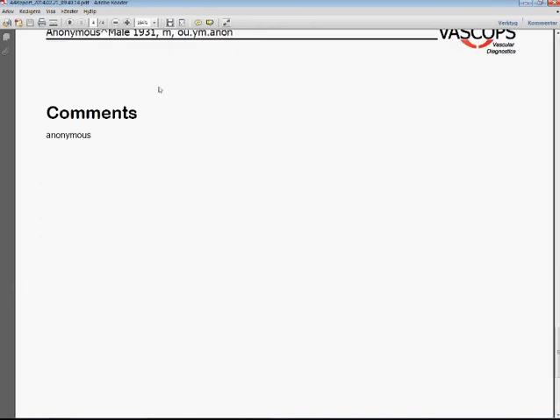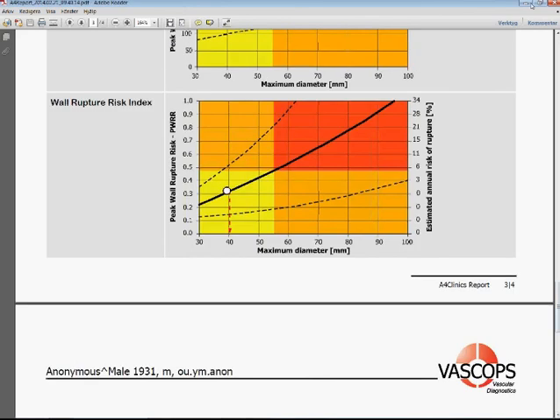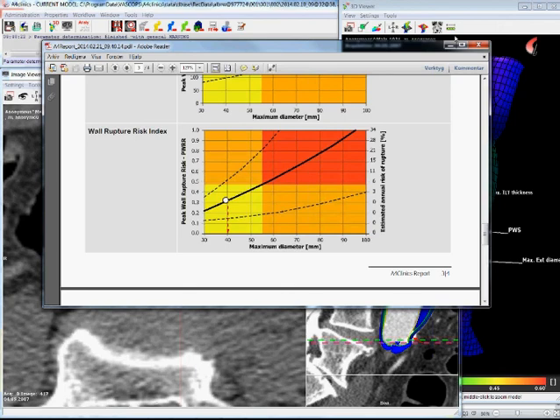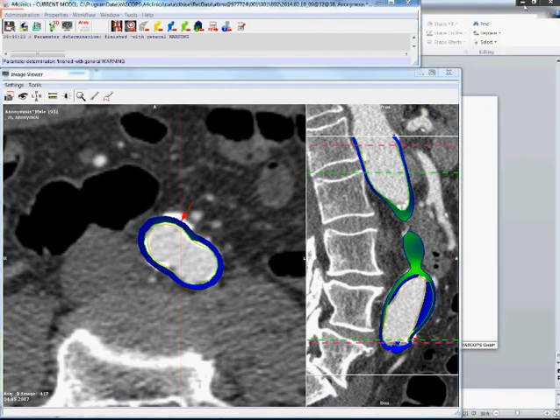Right, then down here would be this additional information what you put in this individual patient, in your individual examination report. This would be down there. So I think this is a fast run through what this software, what this concept is able to do.